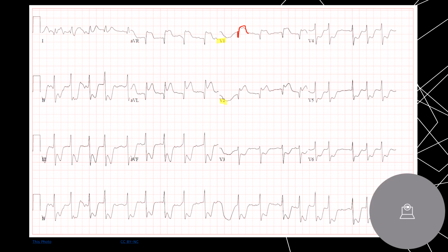Count on it. P waves can disappear. QRSs can kind of disappear. Only because of just damage or amplitude, but T waves are always there. So if this is baseline and there's a J point in here somewhere, then guess what, guys? That is elevation. Okay, elevation. Same here. Like, look, baseline. Look at this QRS. This QRS comes all the way up and then hooks right here, here, and here. But you see what I mean?